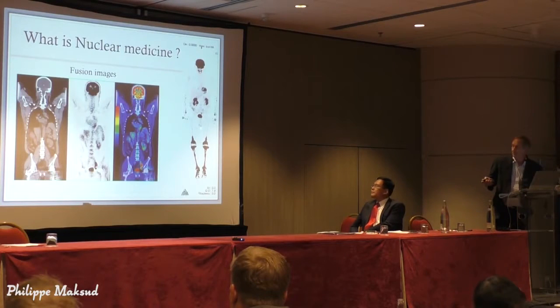Here you can see a volumetric PET image that shows a typical ECD pattern with medullary bone fixation at the legs, on the legs.